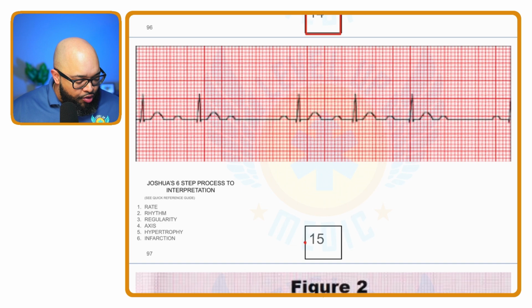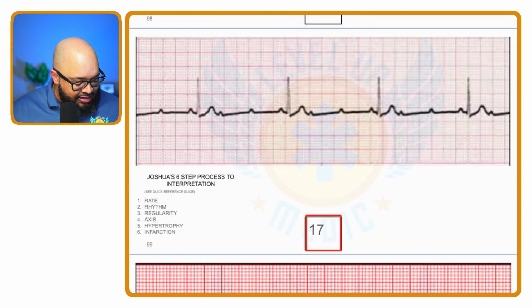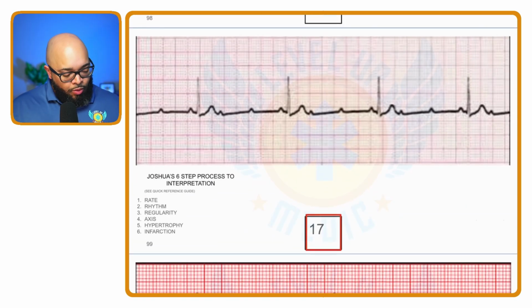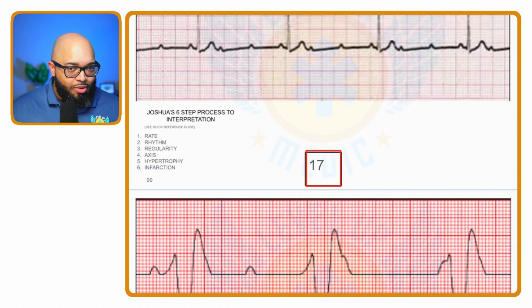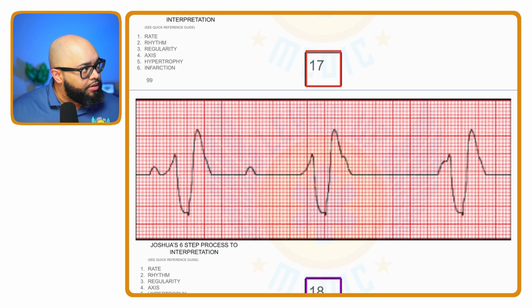All right, let's go. I'm going to skip 15 because you've seen an example like that, and 16. Actually, you've seen an example like 17 as well. I want you to see if you can figure out number 17, for instance, based on what you've been taught. And you can always check yourself at the end. Let's go to number 18.